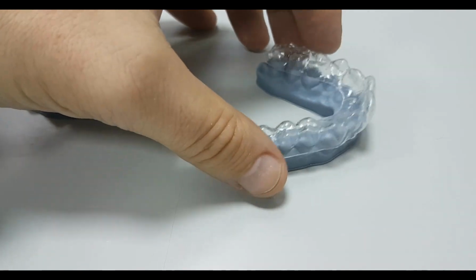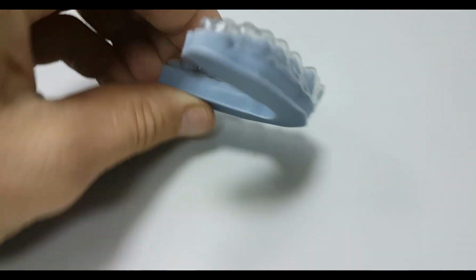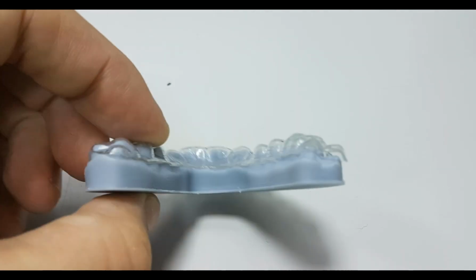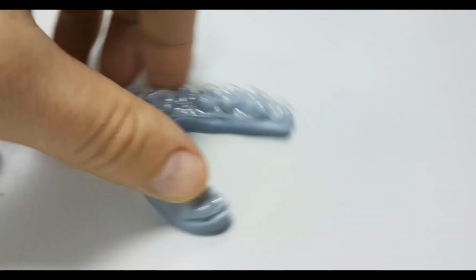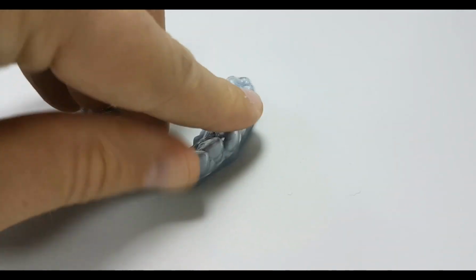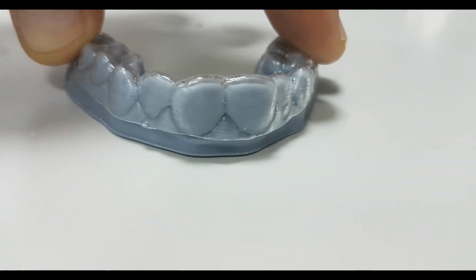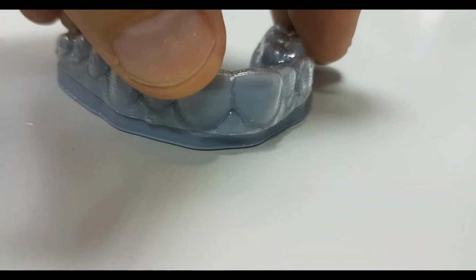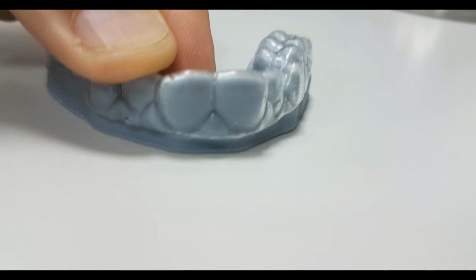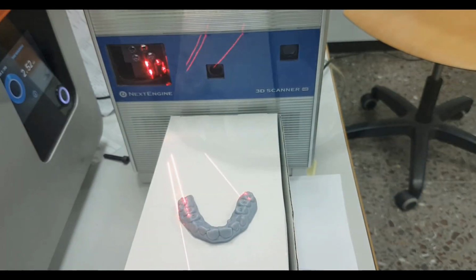And when I went out and placed the aligner, I checked the same problem persisted, almost to the exact same degree. At this point, I was very sure that it was no longer a problem of my 3D printed models. It must have been something else. So just to make sure that my 3D printed models were okay, I went on to a subsequent step that I think is recommended from a quality assurance point of view, and I went on to 3D scanning the model.